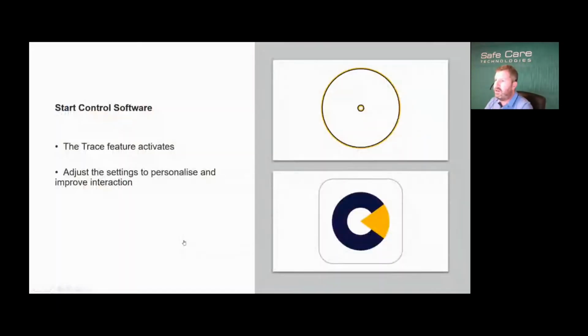So again, there's nothing really new in this piece. There's nothing unfamiliar to people who may have done calibrations or set up eye tracking in the past. So that's your setup. Pretty straightforward, and pretty similar to the way it was.